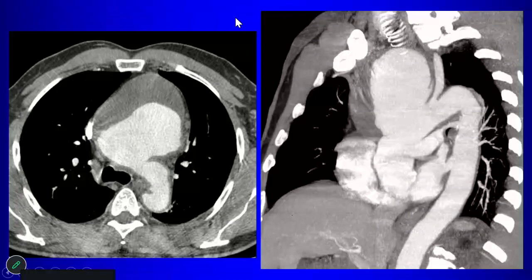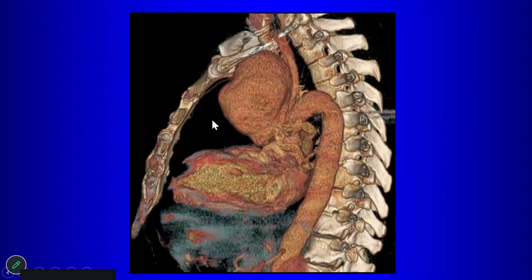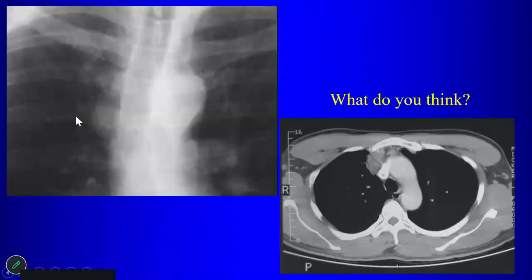Aneurysm. It's an aneurysm, but it has this very irregular appearance, right? So this turns out to be a large pseudoaneurysm. So when you have aneurysms like that in unusual location, especially when it's large like that, what do you think of as etiology? Mycotic aneurysm, right? So remember that aneurysm can occur anywhere in the mediastinum. So you want to make sure that you're not dealing with an aneurysm. You can imagine if you're doing a biopsy on non-contrast CT, don't stick a needle in this because it might not be obvious that this is connected to a vascular structure. So always consider aneurysm in your differential diagnosis for any of the mediastinal compartments, especially if you're asked questions about biopsying the lesion.